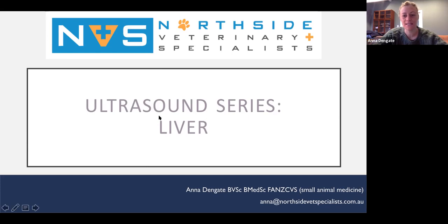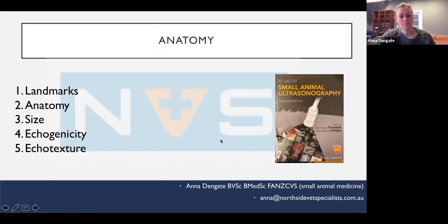So please, I want feedback on this. Please let me know if it's not working for you or if you just can't see anything in it. What I want to get out of it is for everybody to have a way of looking at things, so you've always got something to say. You can always get something out of an ultrasound image, because there are so many factors that make images poor quality, even live, even when you're doing it yourself and the probe's moving around and you've got control of it. So at least we can get the gettable information out of it.